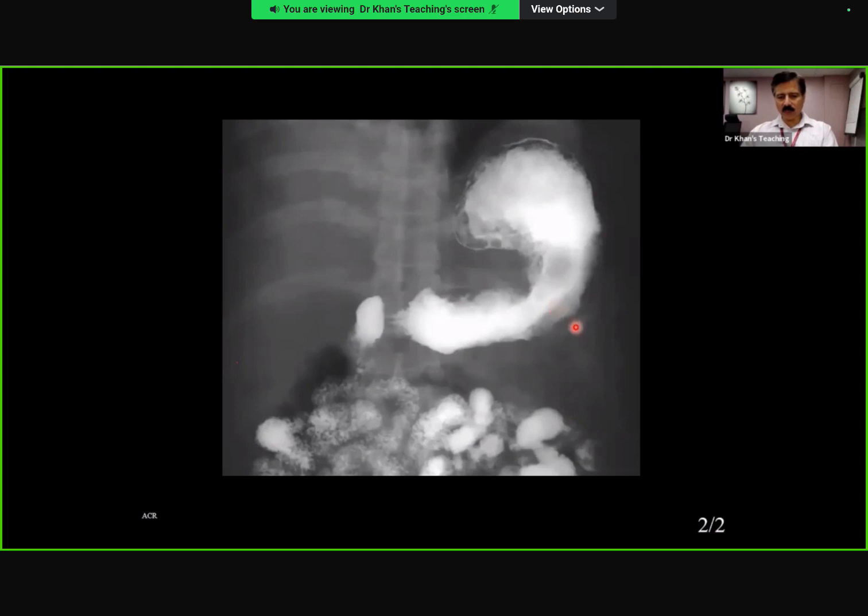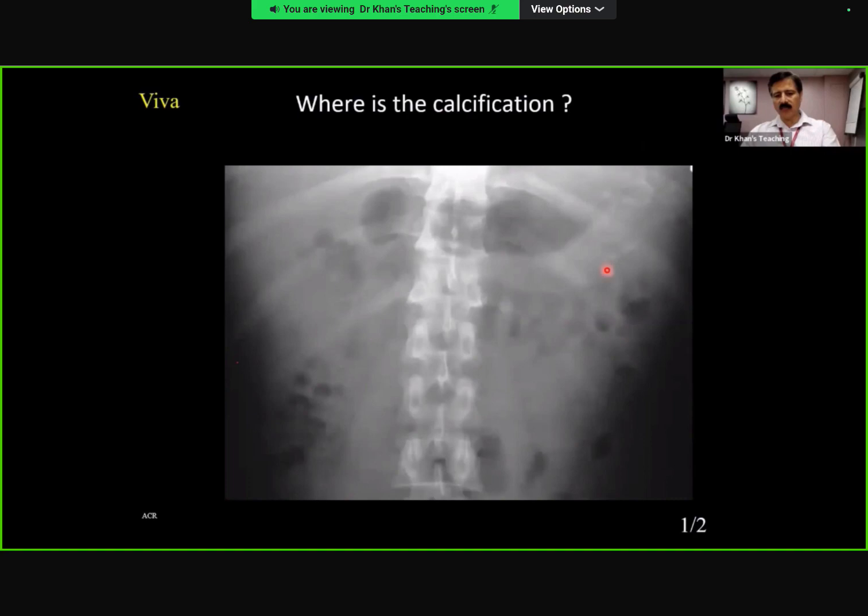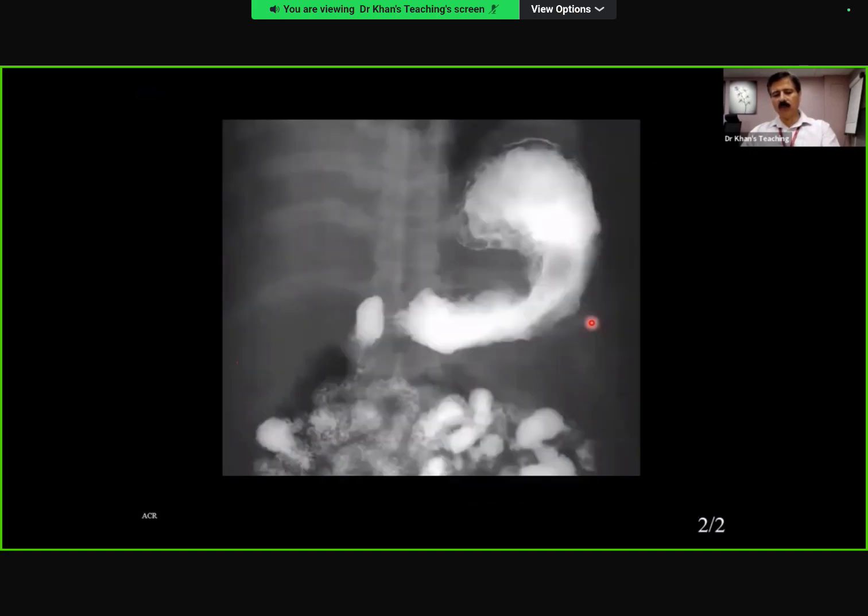Yeah, actually you can see it. You see from here to here is that thickening. Now if you go back, this is that calcification, and look at the shape of that calcification. It goes with the stomach. Very unusual case. I'm not expecting that you will pick it up, but just to develop your eyes, sometimes these kinds of things happen. And the basic thing is that this is linitis plastica, and we will cover it in the next session in detail, where there is loss of distensibility, and you can see that there is mural thickening also.